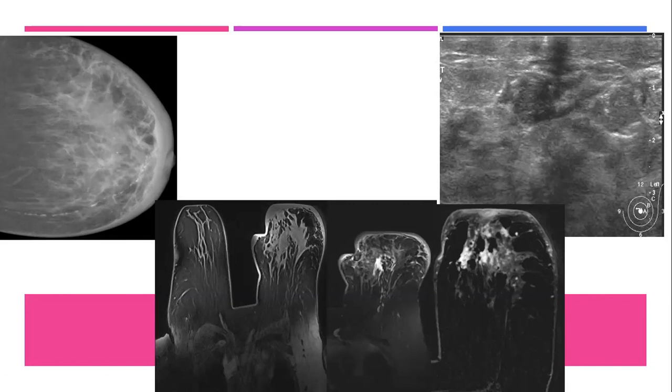Post-contrast shows multiple areas of contrast enhancement. Do we call them masses? If we call it a mass, then we have to see it on pre-contrast. A mass is usually seen on pre-contrast, it is three-dimensional and has convex borders and all these features.